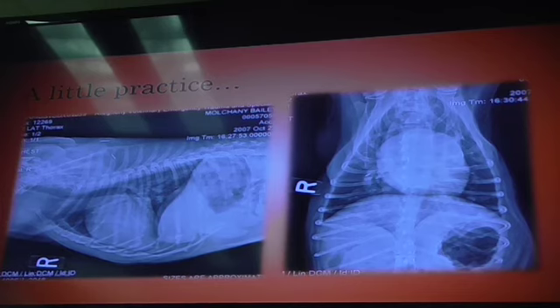Spine of the scapula. Okay? You guys see these opacities coming straight down. Remember, that's because he's sitting like this. Alright? So, we just need to look at midline. You should see this tubular opacity that is the trachea, going down like this.